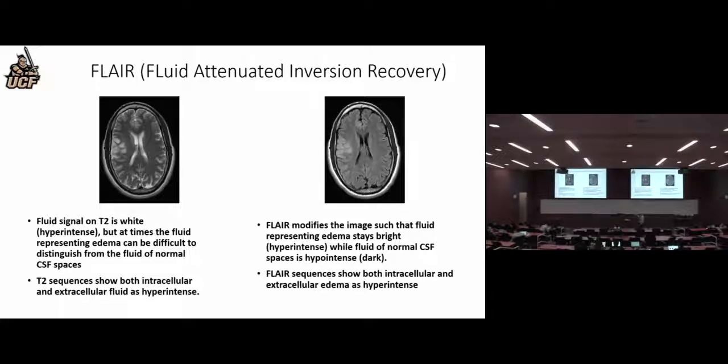But the things like stroke still show up as white. So this is actually before there was DWI, this was the most sensitive thing to pick up an early stroke.